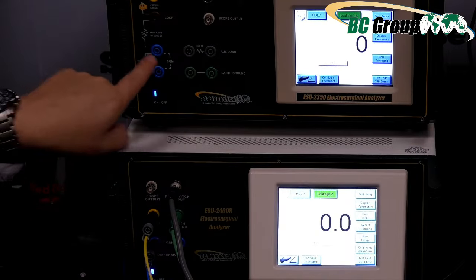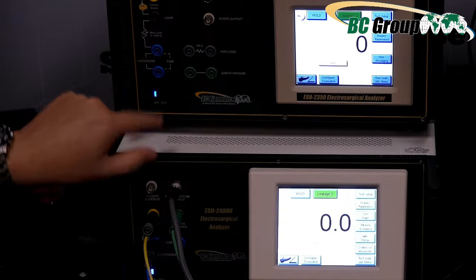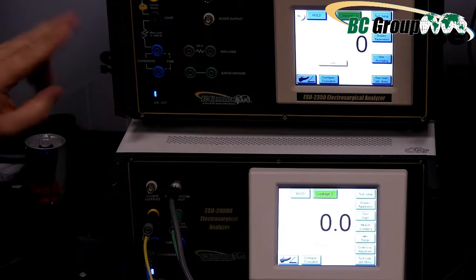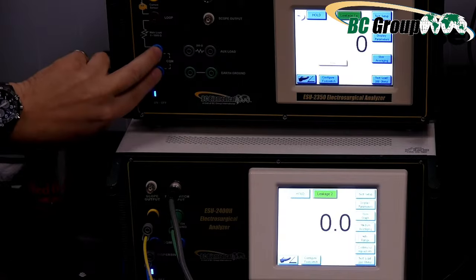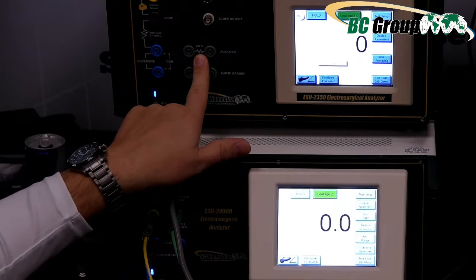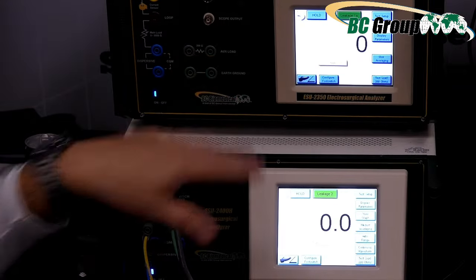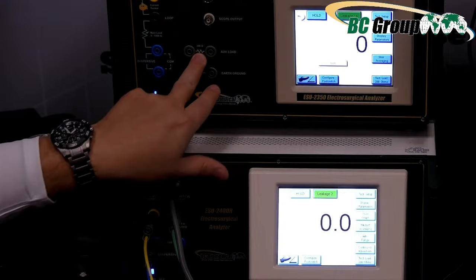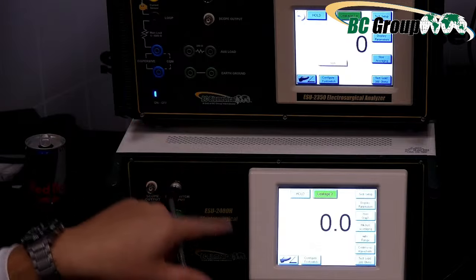But you can see there is a silk screened depiction of it, so you know exactly what 2 ports are needed for current sensing. Then we have our main load right here, which is 0 to 5,500 ohms, and then our dispersive or CQM, because people call them different things, right? But again, there's a depiction showing that these 2 blue colored ports are related. Over here, I have a 200 ohm load, and there's 2 banana ports right here. That right there indicates, let's say you as a human or as a patient, that 200 ohm load is supposed to depict a human body, what if, which is what we're going to see in just a moment.